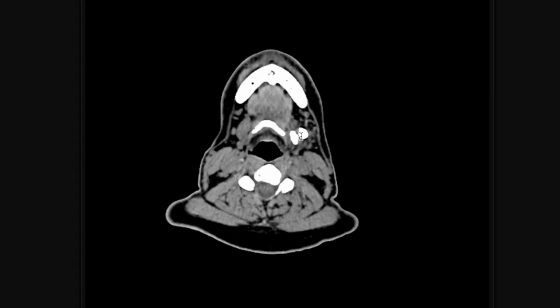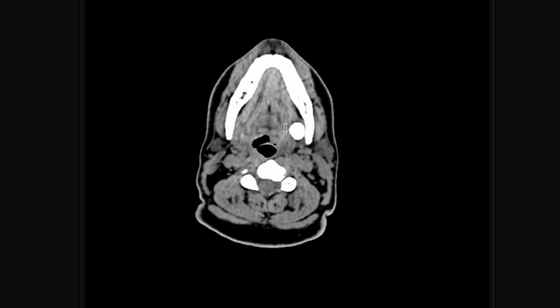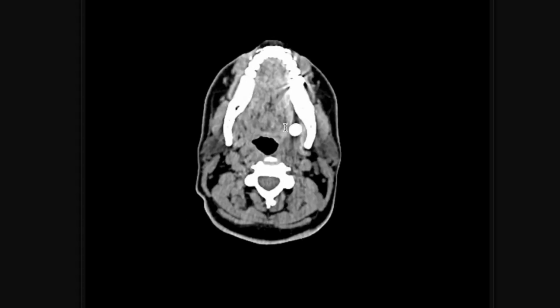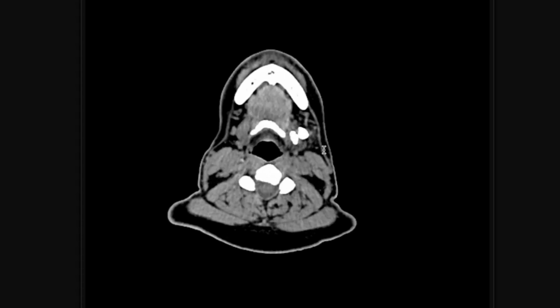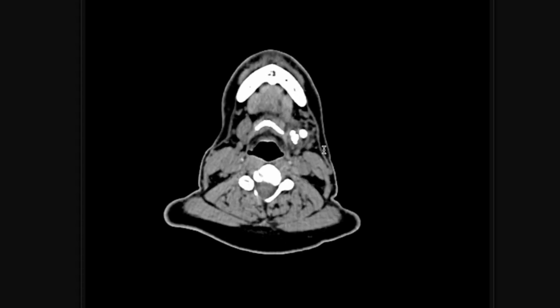Surprisingly, the intra-glandular ductal radicles are actually not dilated, and obviously the left SM gland seems to be much more enlarged compared to its counterpart. The parenchyma also happens to have signs of atrophy here. Now if I focus right around here, we can see that a small portion of the cervical lymph node seems to be reactive to those changes.